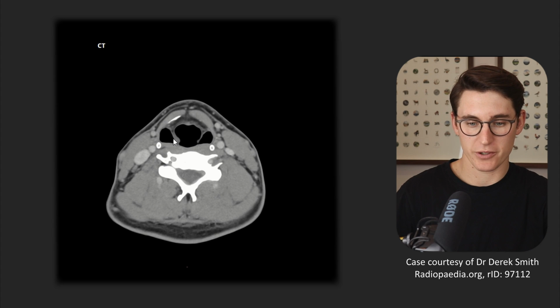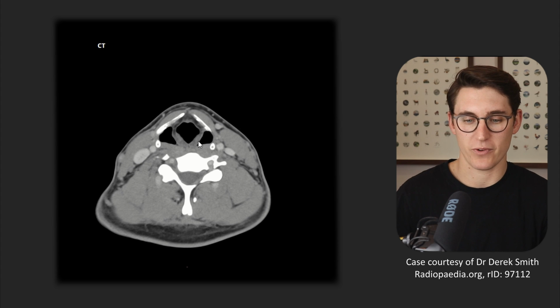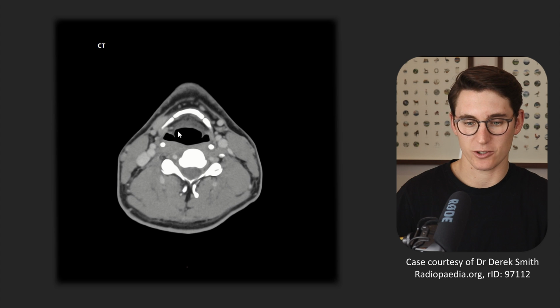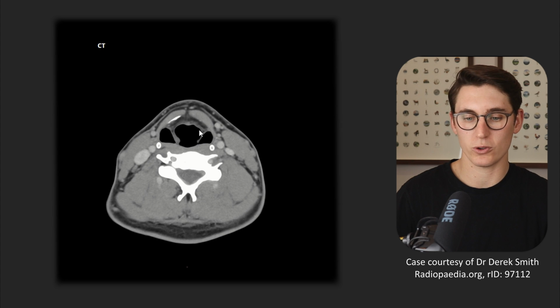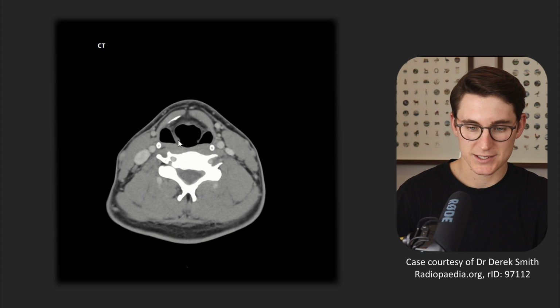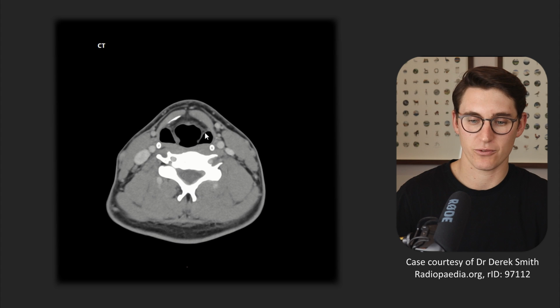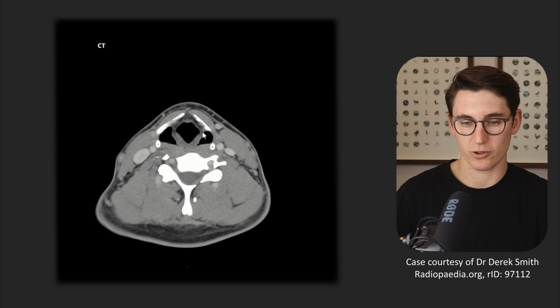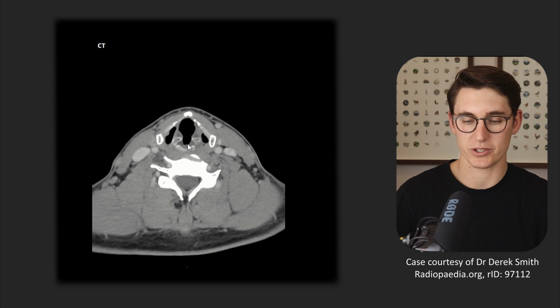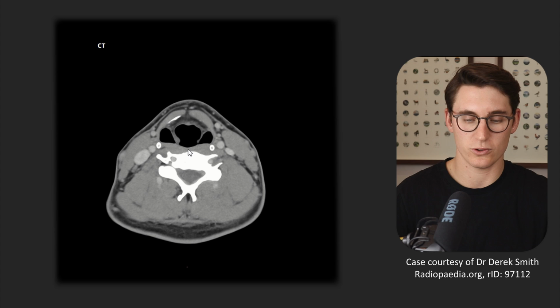Posteriorly, we can see these piriform sinuses that don't form part of the larynx. They actually head down into the hypopharynx. So as we head back up, let's look at this epiglottis coming down. We should see our aryepiglottic folds now come into view. We're scrolling inferiorly on the patient. This is that tissue that heads from the arytenoids to our epiglottis, our aryepiglottic folds. Our aryepiglottic folds then should come down towards the arytenoids. Here are our arytenoids.